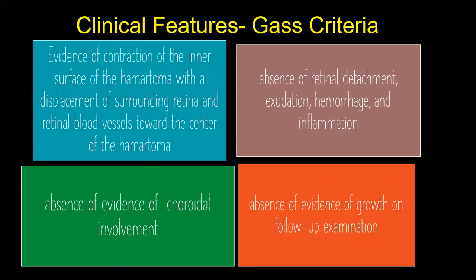There is absence of retinal detachment, exudation, hemorrhage, and inflammation. Absence of evidence of any involvement of choroid. There is absence of evidence of growth on follow-up examination, but based upon the recent literature, growth in these lesions have been reported.